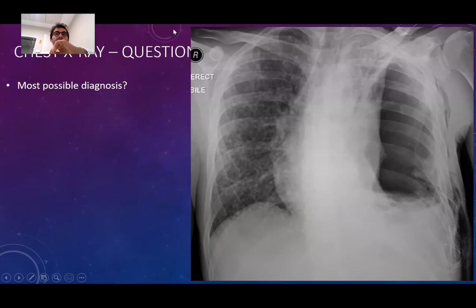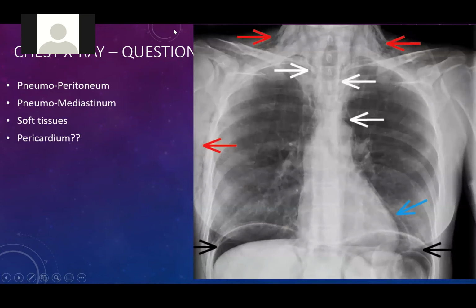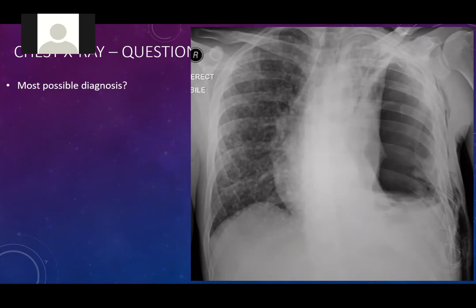This was a difficult case. So it's a mixed case. What's the main problem here? Well, I think the main problem is the pneumothorax on the left side, first of all. Right, doctor? Pneumothorax can be life-threatening. Reticular nodular densities on the right side are probably there for years.